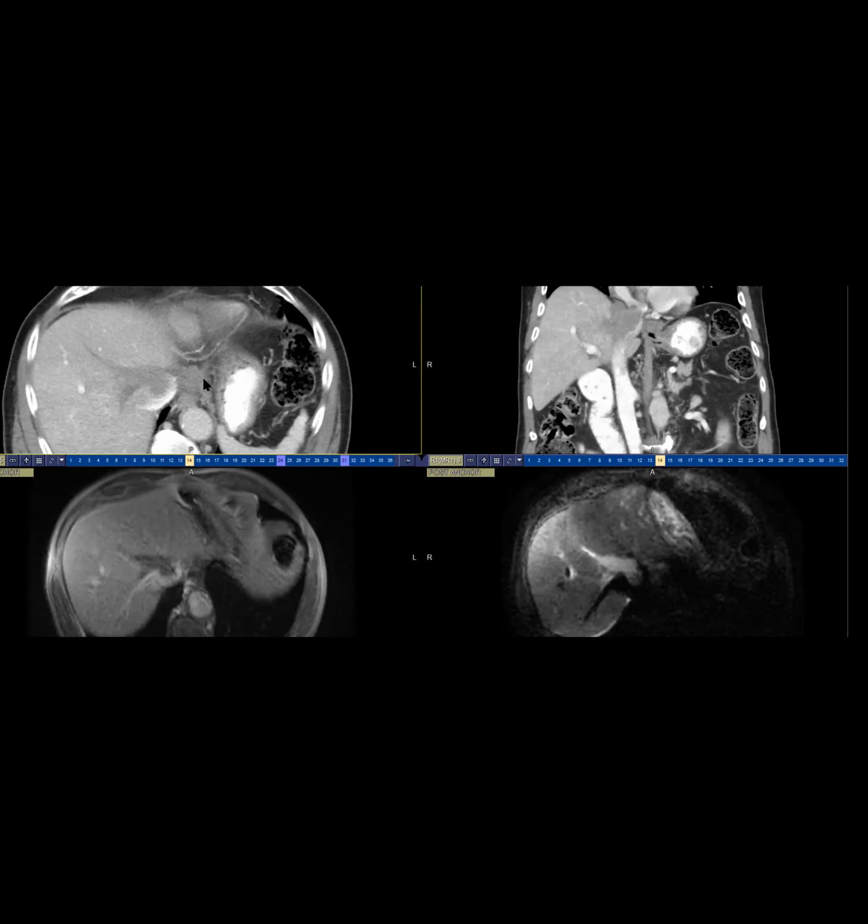And this is not actually very common. Even looking at the literature of intravascular lymphomas and tumor thrombi that turn out to be lymphoma, it's very rare to get the IVC. There was a case series of 14 cases, and 2 of them were in the IVC. And similar to this patient, 1 of them had a diffuse large B-cell lymphoma. But it's just good to keep it in mind and not to dismiss this filling defect quickly on the axial without looking at it further.